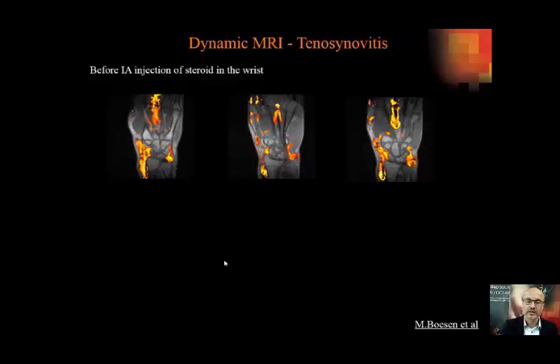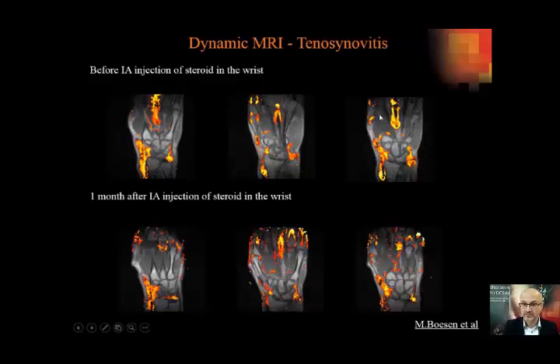If you don't address the anatomy of interest, then usually you don't have as good a treatment response as you would have if you, for instance, locally inject an anti-inflammatory injection directly into the tissue of interest. And in this case, you see that there's a high tenosynovitis involvement in a patient, and also some wrist joint involvement. Usually when you inject these patients, you inject steroid here between the lunate bone and the radius, and this patient was suspected to have inflammation in the wrist because that's where the symptoms were, tenderness and swelling, but you could not, based on your clinical examination, actually assess the tenosynovitis.